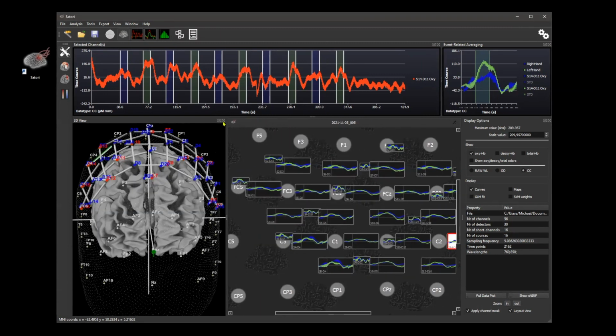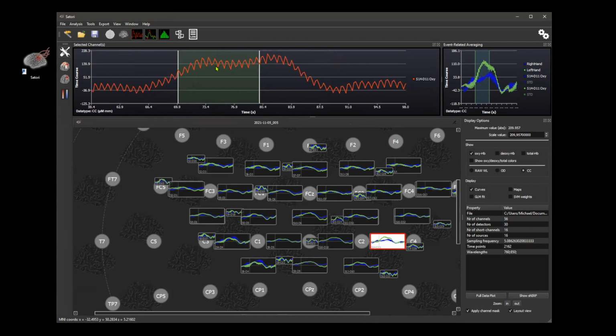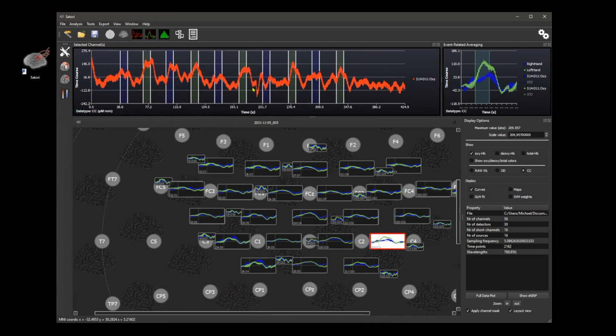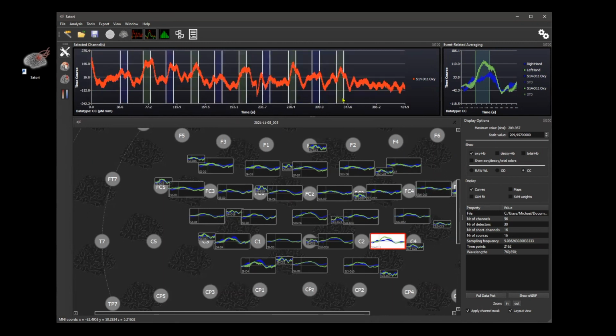Okay, talking about analysis, let's do some pre-processing of the data. So we can see that the data in the raw form has heartbeat information in there. You can see these frequencies. We are scanning here with 5 Hz, so they're not as fine-grained, but their resolution is enough to see them nicely. And then we can see some artifacts here, some spikes, and some slow drifts in the data. So we want to basically get rid of some of these artifacts.